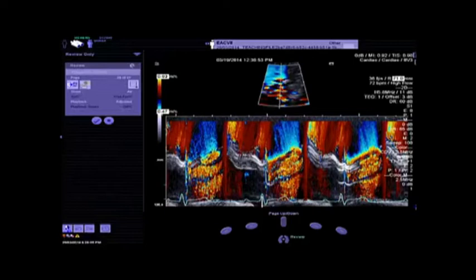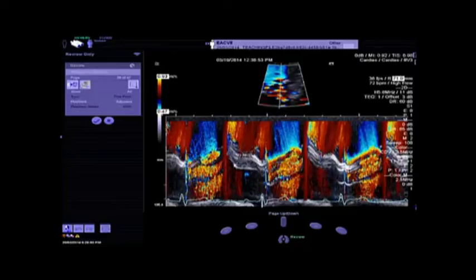And here you have, during the systole, the regurgitant flow in M mode, and you can see that the flow is constant throughout the systole. And in this kind of patients, what you have to take care of is the late enhancement of the flow, which is in these patients not really seen, except maybe in this part where you see that there is a difference between the beginning of the systole until the end of the systole.